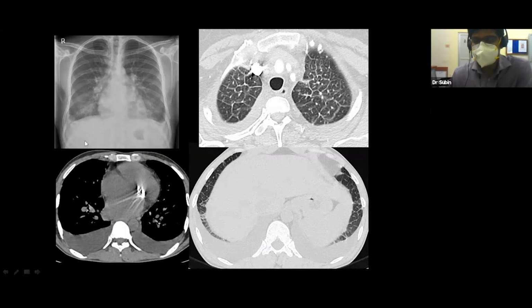I think X-ray is most difficult, no, than CT. You looked at this and said crazy paving, but I want you to tell me the whole picture. Can you see these hidden areas? I told you yesterday: the apex, the CP angles. So this one is pleural effusion on both sides. And can you see something here? Some dilatation of the left atrium. Okay, there are some opacities around these regions, some perihilar opacities.